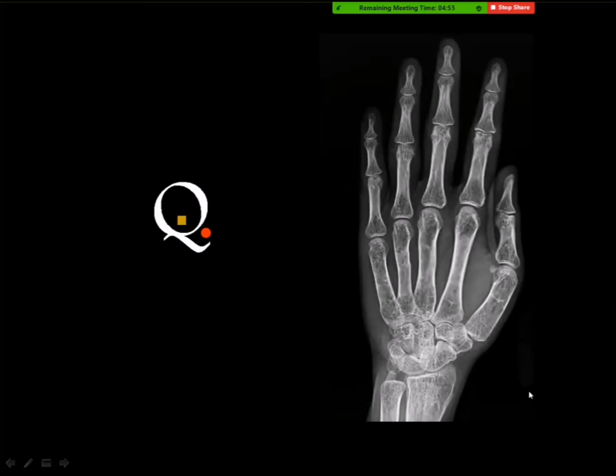And this is the hand of a patient with sarcoidosis. No, this is hemolytic anemia, and you remember in the lecture of hematological bone diseases, thalassemia and hemolytic anemia, any form of hemolytic anemia will present itself in the skeleton by marrow hyperplasia. And marrow hyperplasia means expansion of the bone and increase in the trabecular pattern. This hand is classic for thalassemia or any type of hemolytic anemia.